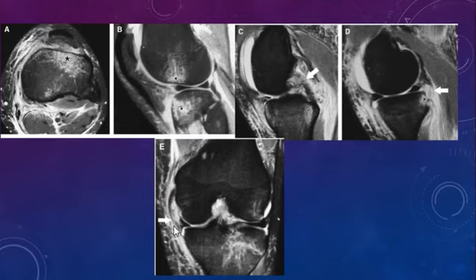This is the medial collateral ligament here torn, and you can appreciate the avulsion fracture due to the pull by the medial collateral ligament. Here is the tibial fracture, and here is the medial collateral ligament.